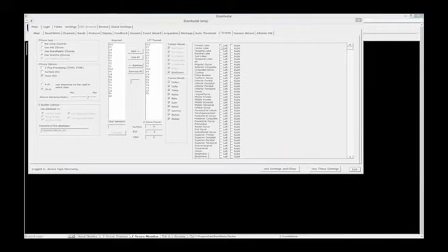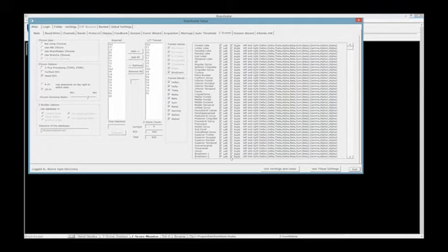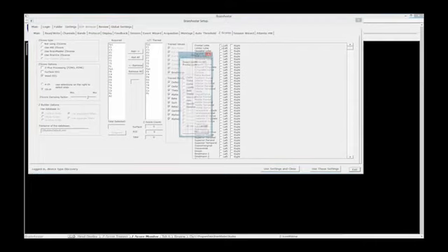So as opposed to doing that, I'm going to click this, and I'm going to hold my Shift key down, and I'm going to go all the way down to Broadband 2. As you can see, that's enabled all of them. I'm going to do the same over here. I'm going to click that on, hold the Shift key down, go down. That's an easy, quick way to turn things on or off. So I'm going to click again, hold the Shift key down, and go up. I'm going to click again, hold the Shift key down, and go up. So have no fear about something being a little overburdened. There are tools that we give you on there that allow you to do different things.